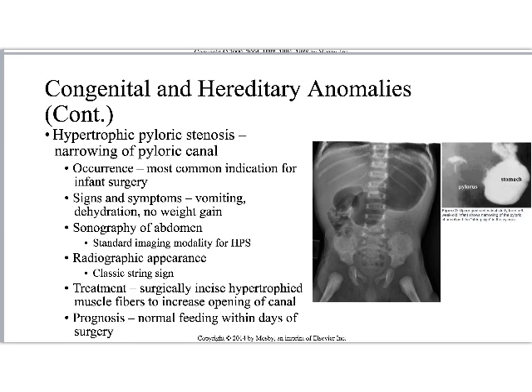If we get down to the lower bowel, we'll see a string sign down there as well. It means something totally different because the stomach's not there, right? Stomach's in this upper area. So just know that about the string sign. It is generally a barium sign, where we're just seeing a little tiny string of barium get across. We generally incise this area.